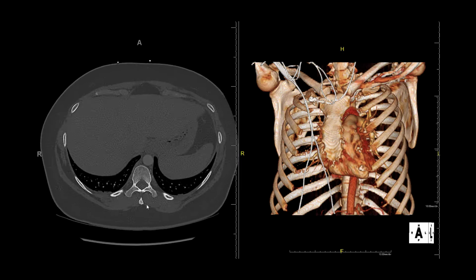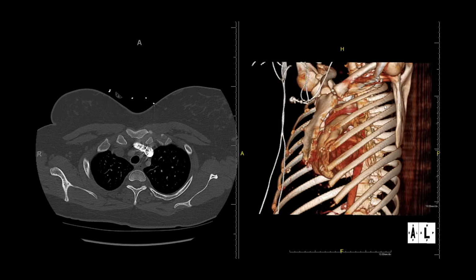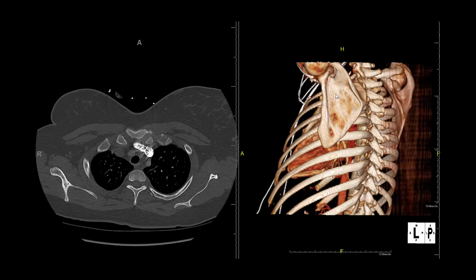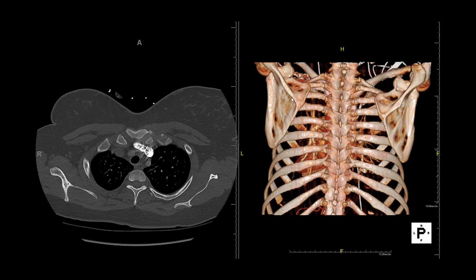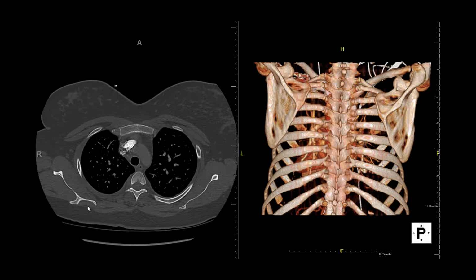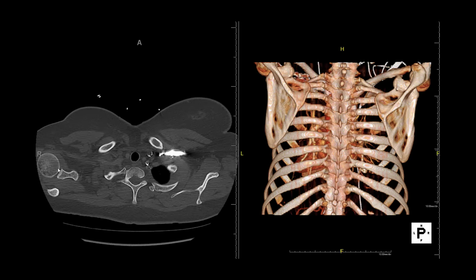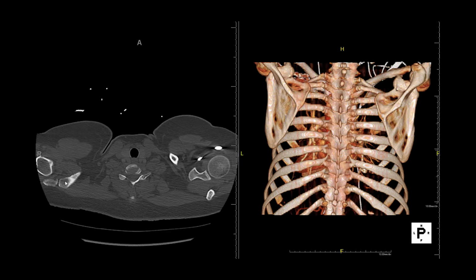Next up is the scapula, and you have 2 scapula, located here posteriorly, and they are part of the shoulder girdle. Here we're looking from behind at the patient's left and right scapula. On the CT scan, you can see the scapula posteriorly here. They will articulate with the humerus, as well as the clavicles.